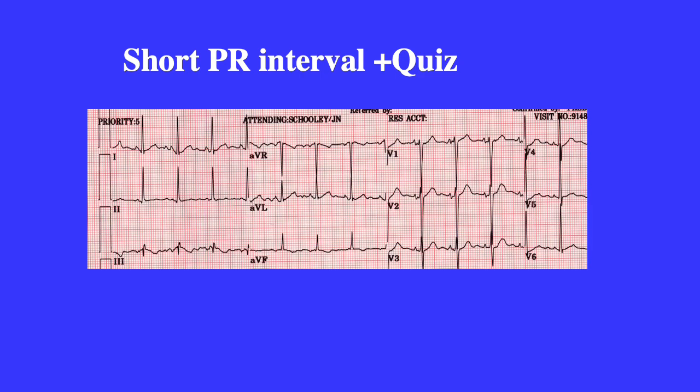Now what else does this patient have? If you actually look at the standardization, it's double standard. Here the computer has adjusted because the QRS complexes are probably not that tall, and the computer has adjusted the standardization. So it's really important one looks at the standardization for every EKG before interpreting.